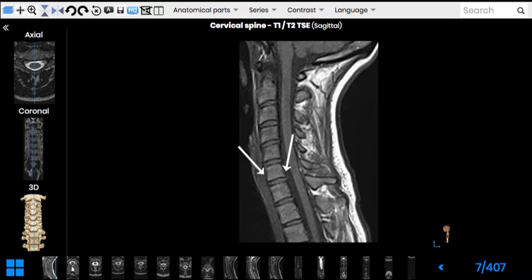Here, and they are the anterior and posterior longitudinal ligaments, as well as the ligamentum flavum just behind here, the interspinous ligaments between the spinous processes, and the supraspinous ligament, which is running up posteriorly here and becomes the nuchal ligament, as you remember, in the cervical region.